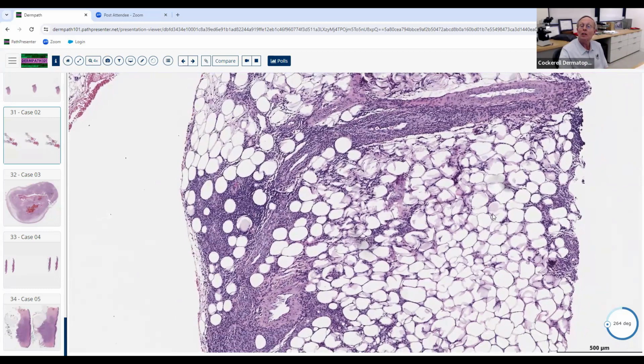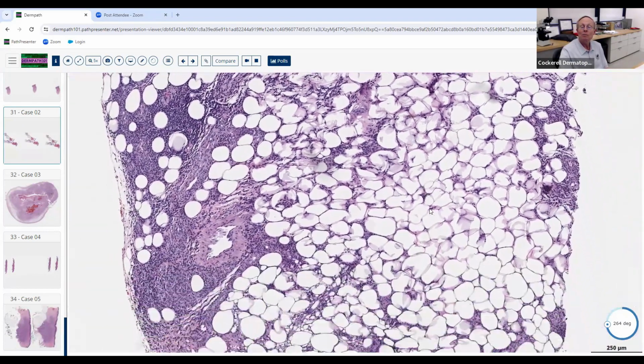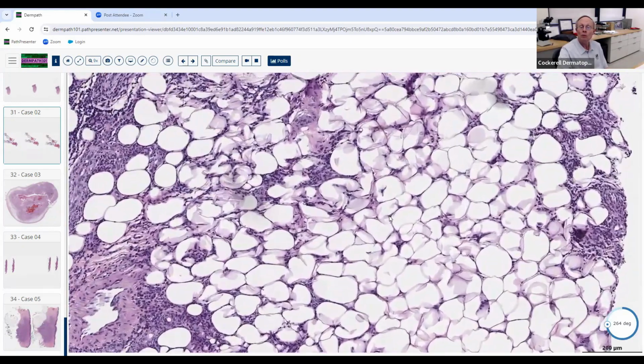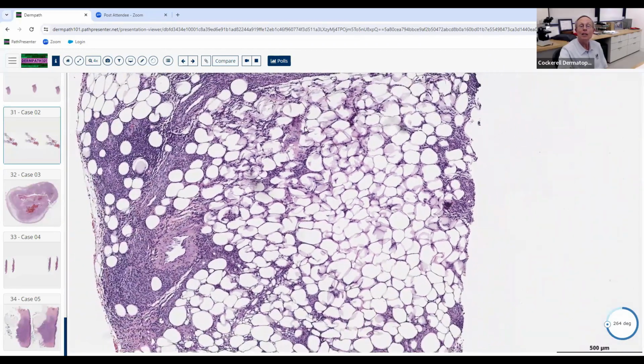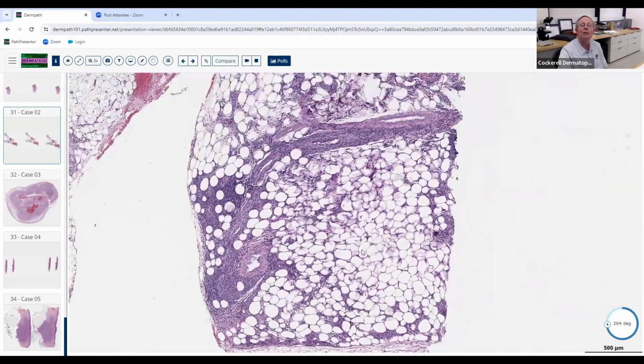Is this any of the crystalline panniculitides? Subcutaneous fat necrosis of the newborn? One of those conditions. You see crystals? I don't see them. So no. It's not sclerema neonatorum. So no, there aren't crystals here. This is just some fat degeneration here.